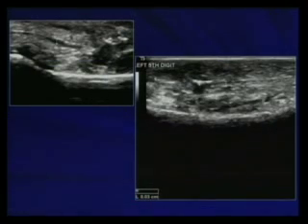In this case, this is a digital nerve. This is a sagittal view of the nerve coming there. This is post-surgical, and I found this small neuroma here, and there was discontinuity, and then distally we found the distal portion of the nerve coming there.